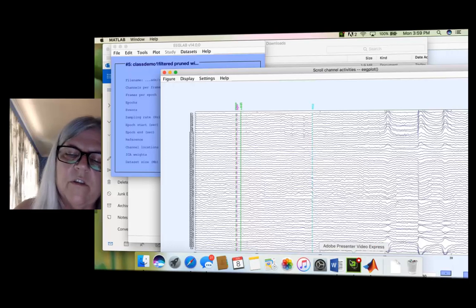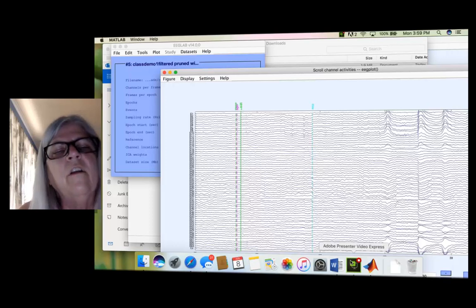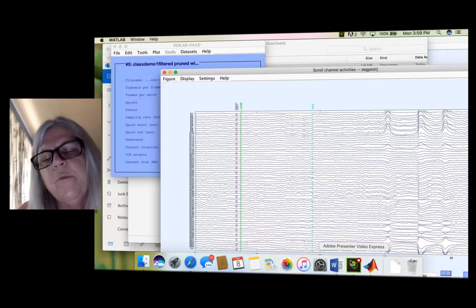All right, so let's stop the video, and you should have enough now to know how to load files into EEGLAB and do the preliminary processing.